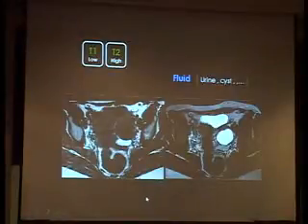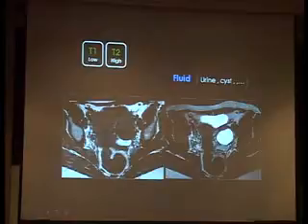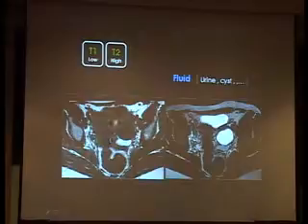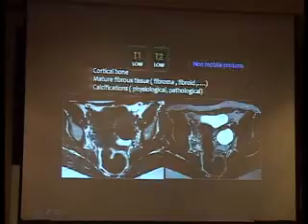If you are not a radiologist, you can know the T1 from the T2 by the signal of fluid. The bladder is taken as an example, and you see the fluid in the T1 weighted images is black, while in the T2 weighted images is white. Then a cyst in the ovary containing fluid similar to that in the bladder will appear black in the T1 and bright in the T2 weighted images.